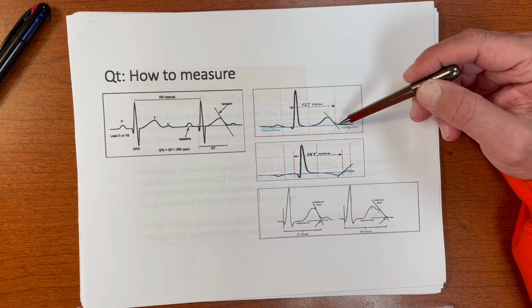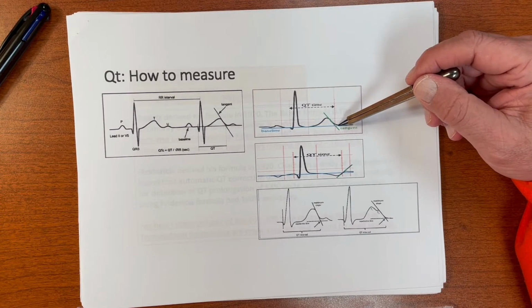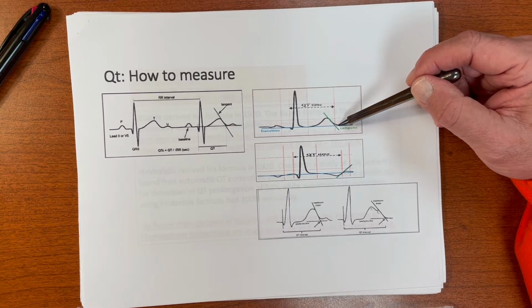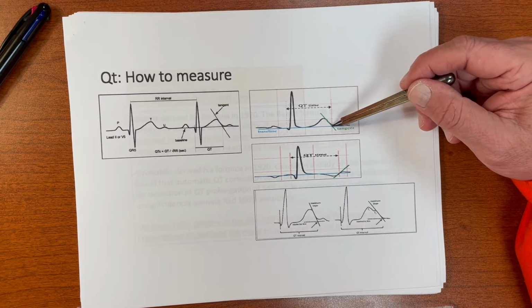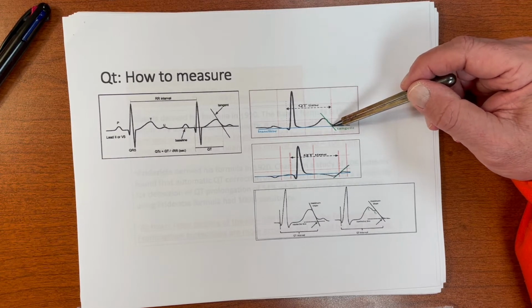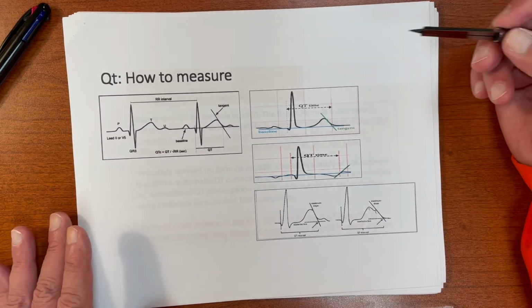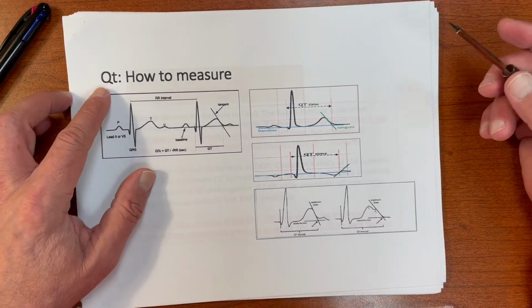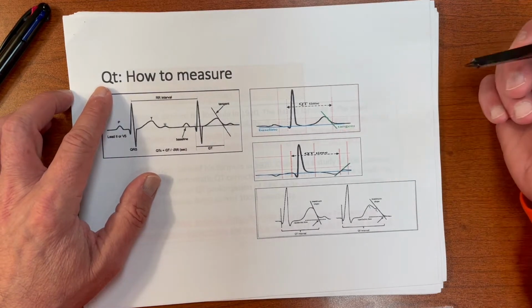If you ask me where the T wave ends, I would say it would end right there, where it goes all the way to baseline. But it doesn't. For measuring the QT, it ends right there. So notice we exclude how many milliseconds. So now we see how the QT as we measure it is typically much shorter than what the computer is going to measure for various reasons.